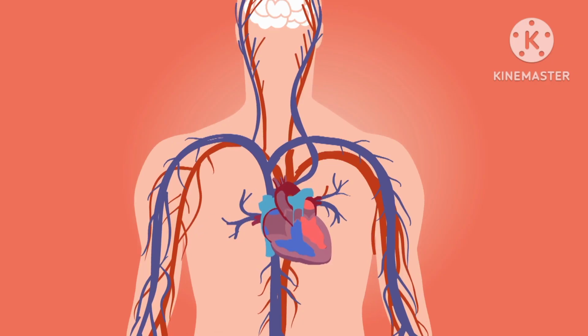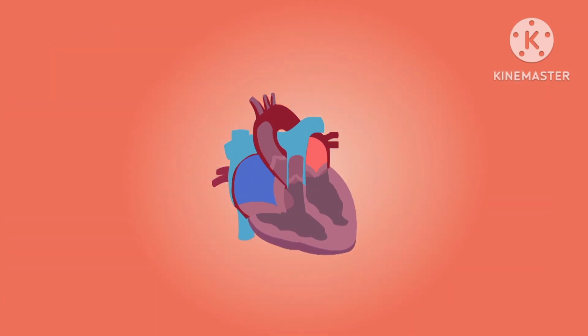Coronary angioplasty is a minimally invasive procedure that is typically performed under local anesthesia, and it usually takes about an hour to complete. It is a common and effective treatment for coronary artery disease, and it can help relieve chest pain, improve heart function, and reduce the risk of heart attack.